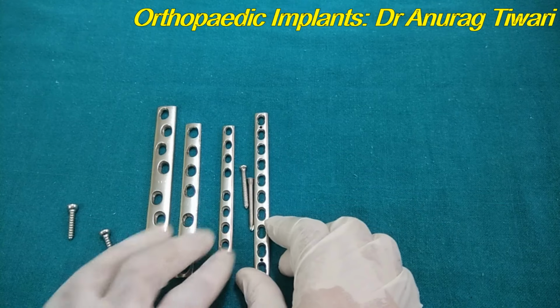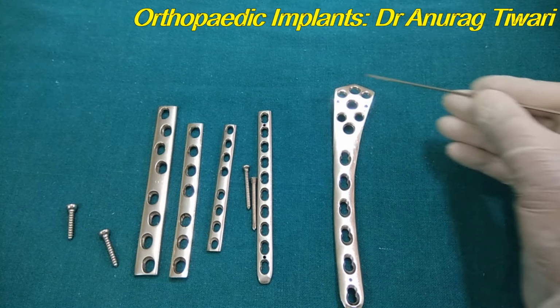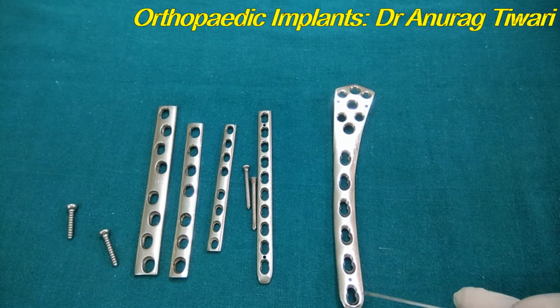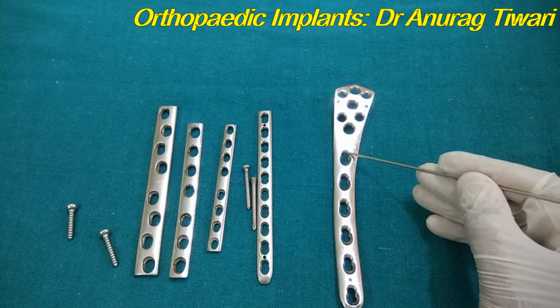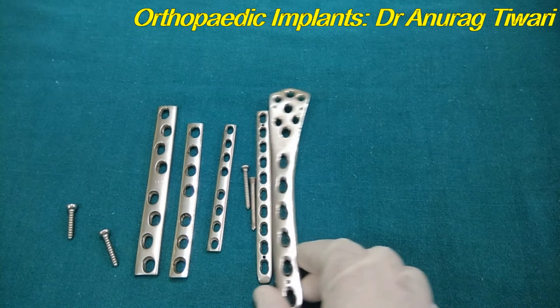Now we have devised numerous other locking mechanisms for anatomically particular regions. For an anatomical region like this, we have this plate. This is actually the distal femur locking plate, the distal femur locking compression plate. This is for the distal femur fragment. We have multiple options: 1, 2, 3, 4, 5, 6, 7. We have seven screw options for the distal femur fragment and this many holes in the shaft of the femur. So again, this is a combi hole. The locking and the non-locking screws can go in this. And always remember, towards the fracture side, this hole will have thread, this hole will have thread, this hole will have thread. These are the locking. The opposite is non-locking. So this is the way you identify the locking plate.